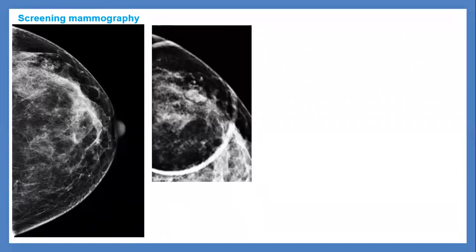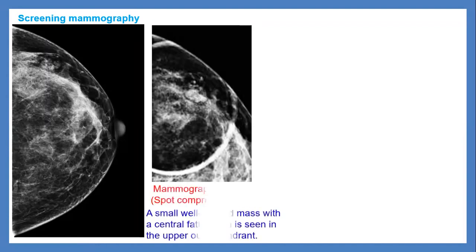Most probably, I think there is a spot of calcification. Or here I can suspect this might be vessels coming near. Okay. So this feature represents intramammary lymph node. Mostly intramammary lymph node.